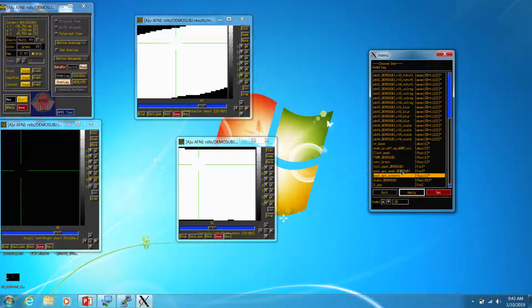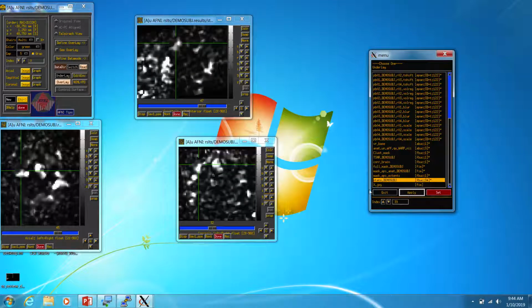So what ends up happening is you don't end up really needing these masks, because that process ends up masking out activation across your whole sample. It's like you take an average, and that drops out all these voxels that aren't really part of the brain across your whole group. Okay. So then the final thing that gets generated is our stats file.